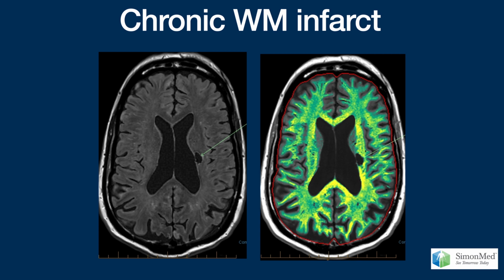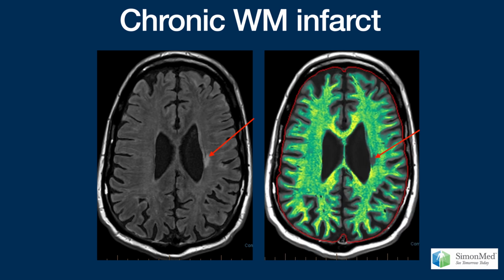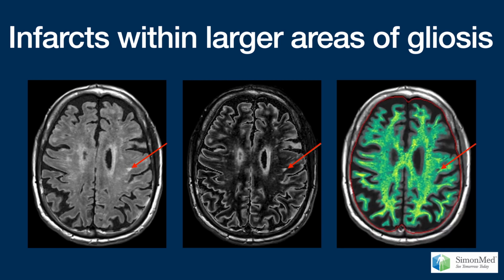Next up is chronic white matter infarct. The central cystic encephalomalacia, of course, has no myelin. But what about the surrounding FLAIR hyperintense rim? Well, no myelin there either. But this is not always the case. Here we have a variety of irregular ischemic changes. Note this lesion's appearance on FLAIR and DIR. And now on myelin, where the center has no myelin, but the periphery has some.